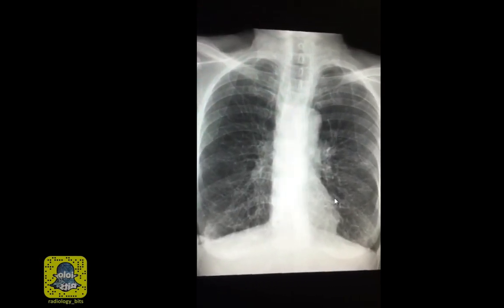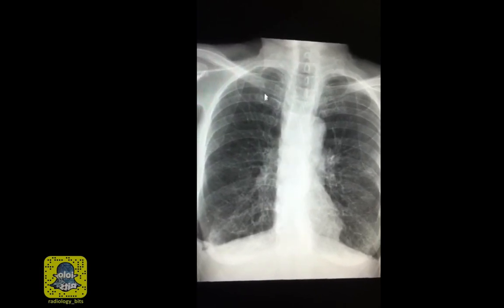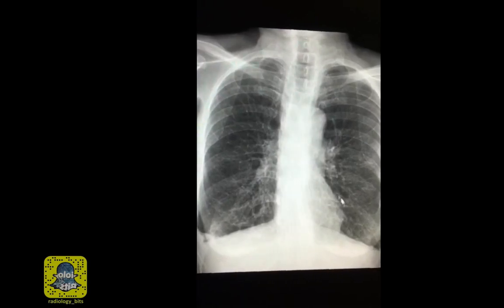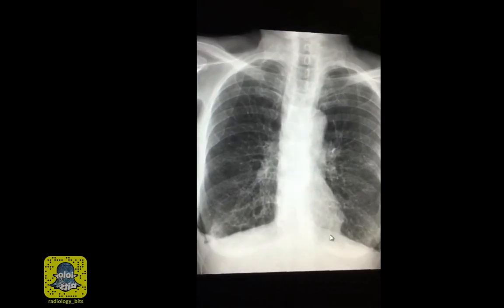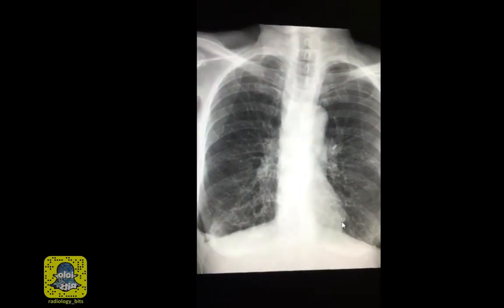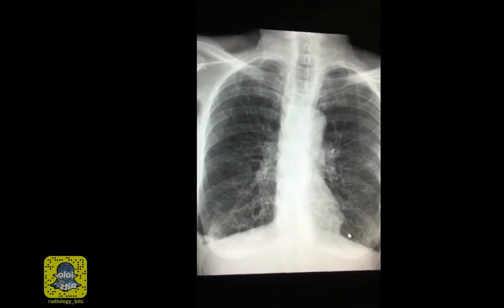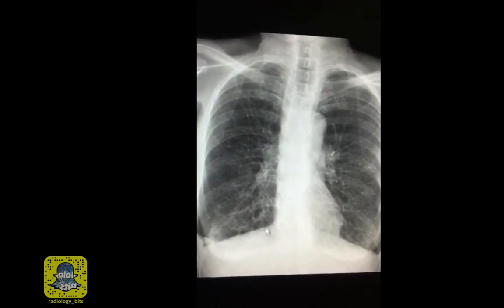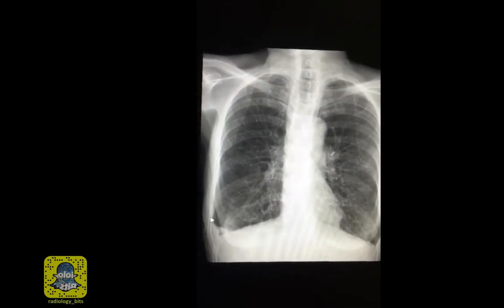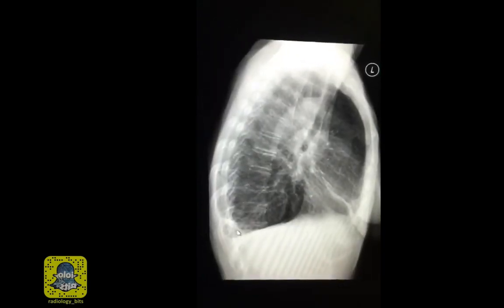However, with chronic bronchitis and respiratory bronchiolitis of smoking, you'd expect the appearance to be at least more diffuse or upper lung predominant. Since the abnormality is seen more in the lower lungs, you might think about aspiration, since aspiration is gravitation dependent. Again, aspiration in a standing or sitting patient would go to the gravity-dependent regions, and that's the lower lungs. Another finding is blunting of the right costophrenic angle, which is consistent with the pleural effusion, clearly seen on the lateral as well.